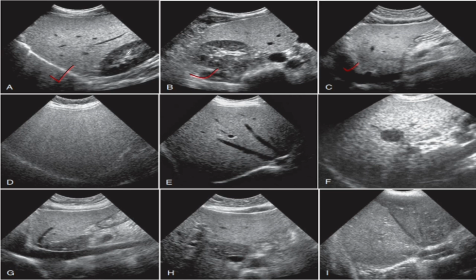Here you can see the liver echotexture is more than that of the kidney. This entire structure is liver, and here you can see this is kidney. If you compare the echogenicity of the liver to that of the kidney, then you can see the liver echotexture is quite higher in all of these diagrams. However, here you can visualize the diaphragm clearly, and you can visualize these blood vessels. Similarly, on diagram D, you cannot visualize blood vessels.